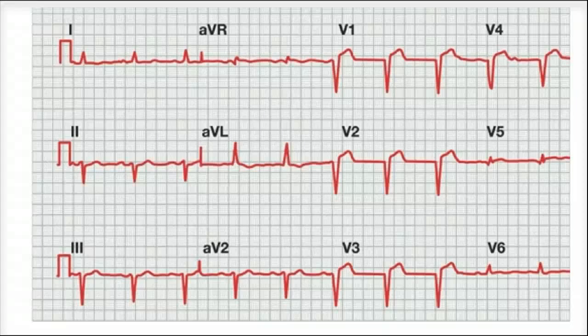So now that we kind of understand what Q wave and ST segment elevation look like, now let's see if we can interpret EKG a little bit more.